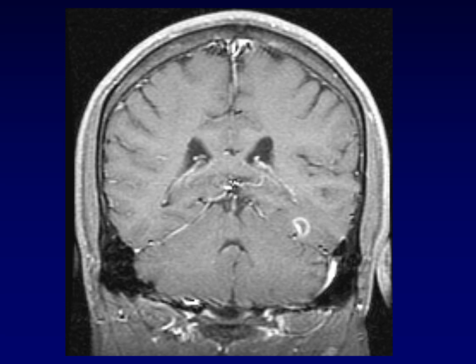This is a coronal image. I haven't shown too many coronal images so far. This is a coronal image of the brain. This one is T1 weighted, and there is contrast, gadolinium-based contrast that's been administered to this patient. So we can look for areas of abnormal enhancement, which would be bright. In fact, here is such an area. There is a rim of abnormal enhancement around this lesion in the temporal lobe.